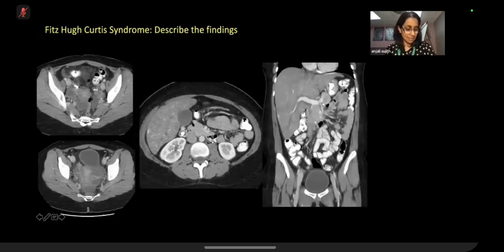So I think we are really short of time, so I'm just taking over. I'm going through the case myself. So we can see pelvic inflammatory disease, fat stranding, fluid. So there is pelvic inflammatory disease.